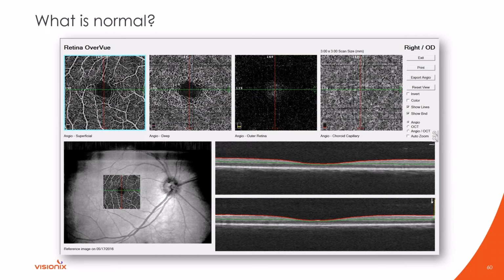So diabetes and diabetic retinopathy, vein occlusions, artery occlusions, things that affect the retinal capillaries. I'm going to be looking at the 2 scans on the left, and I'm going to be looking for: are blood vessels dropping out? Are blood vessels dying off? Do we have capillary dropout? So I'm looking for the presence of abnormal vessel dropout. Those 2 on the left, again, for retinal conditions.